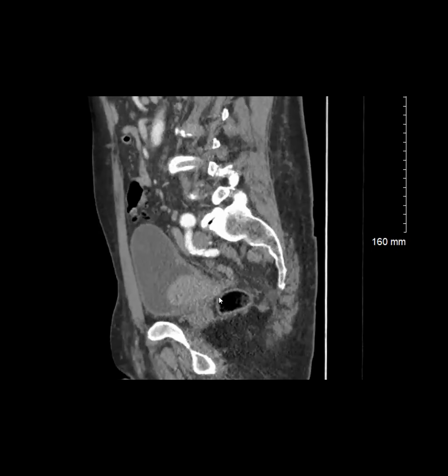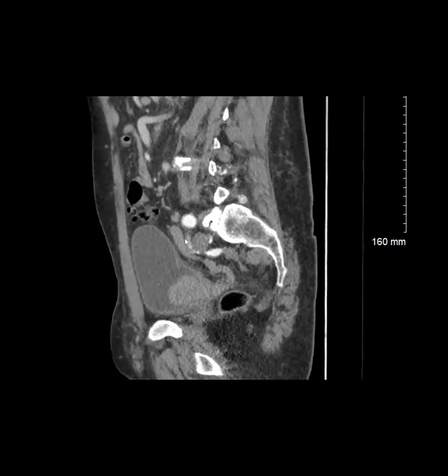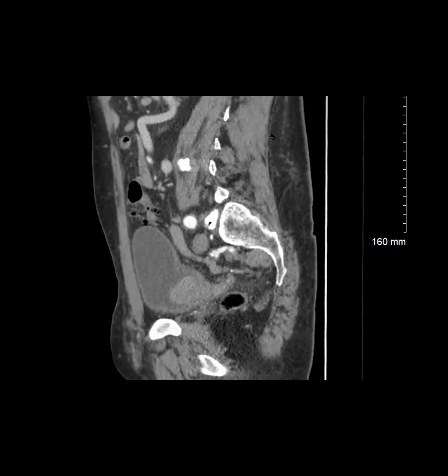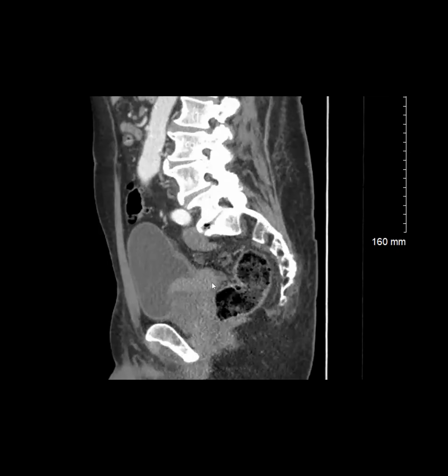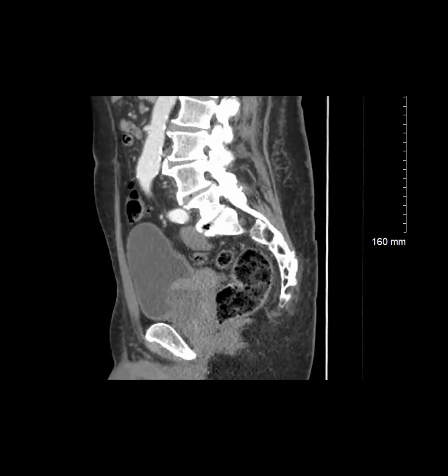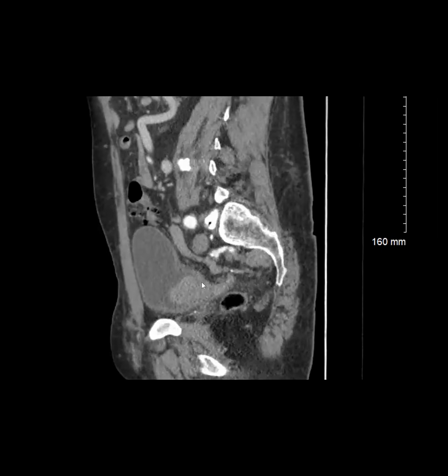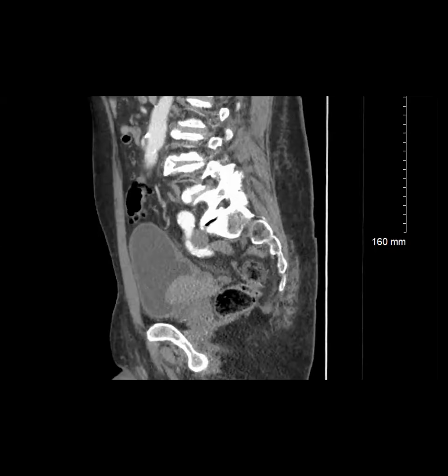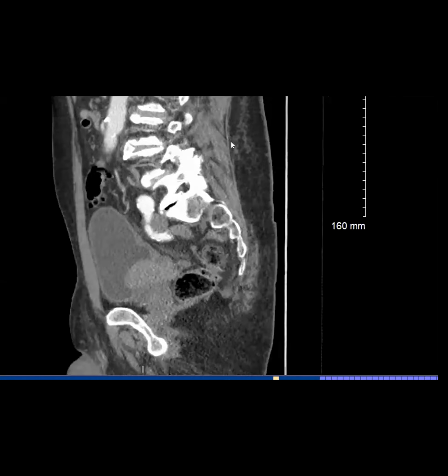Yeah. And then there was a tail-like thing connected. Diverticulum? It didn't fill with urine. This was a single phase. There was no delayed phase, no contrast filling in this area. But anyhow, we weren't sure what this thing is, and he subsequently got an MRI to follow this CT. So let me show you the MR.